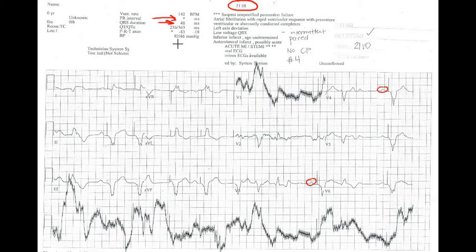We don't always agree with the monitor. And the axis here is -83, which is not a scary axis to worry about. And you'll notice also, if I get that out of there, there is a set of vitals, 92/46. Enough to raise maybe 1 out of 2 eyebrows. Certainly concerned based on what we know about the patient. We want to make sure that he continues to perfuse. Then we go through lead by lead again, same process.